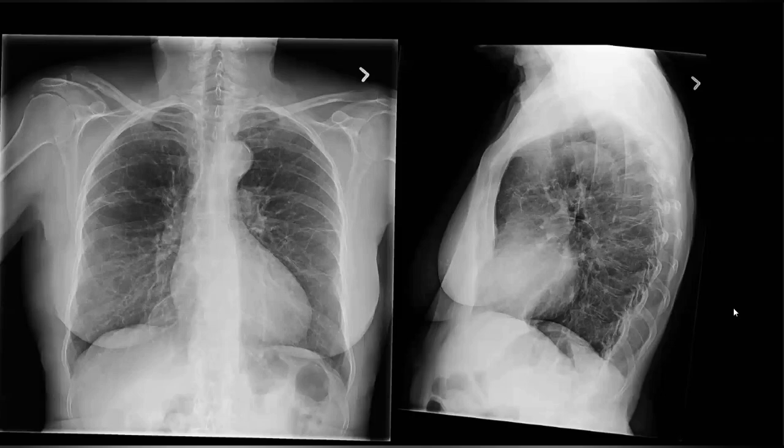Number one. And number two, when you said that you have displaced aortic calcification, this patient does not have displaced aortic calcification. I said, sir, what is the point that you're trying to make? No, sir, I was just pointing out that it is non-displaced aortic calcification. I never said it was displaced. I'm telling you that you said non-displaced, but what is the point that you're trying to make? So it's just to rule out some aortic pathology.